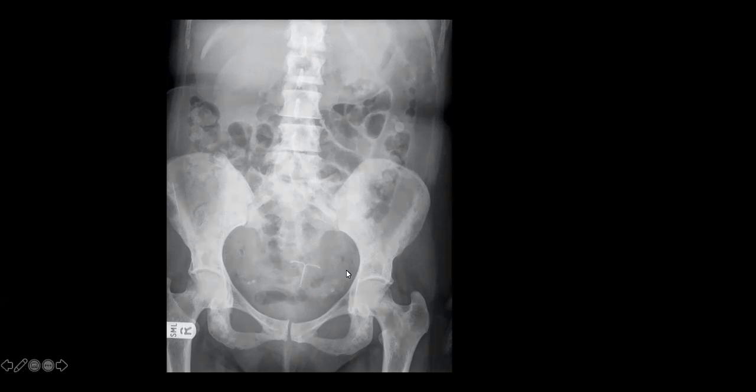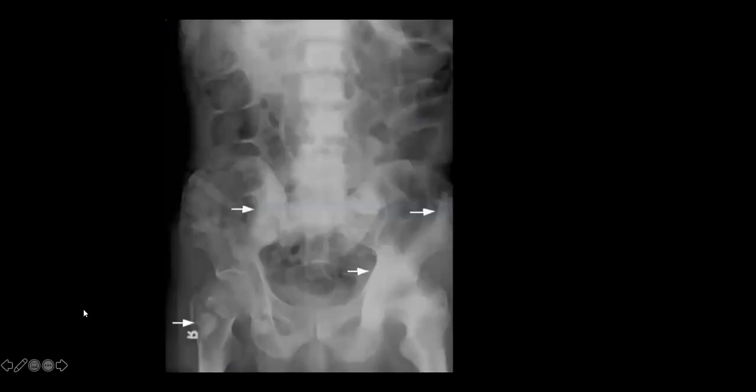And in terms of foreign bodies, you can see here, this patient has an IUD in situ. So again, something that would definitely be written on the report, but very useful if you're the clinician on the ward reviewing the patient, just to acknowledge the fact that you have seen that there's an IUD in place. Again, similar picture here showing sclerotic mets in a patient with prostate cancer, and the sclerotic lesions are marked with white arrows.